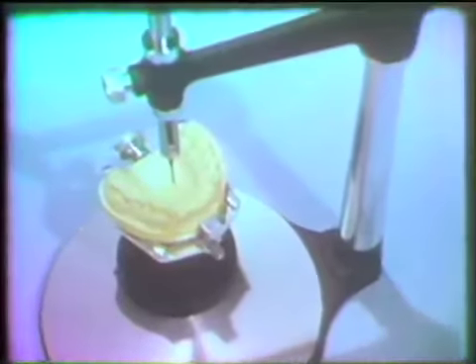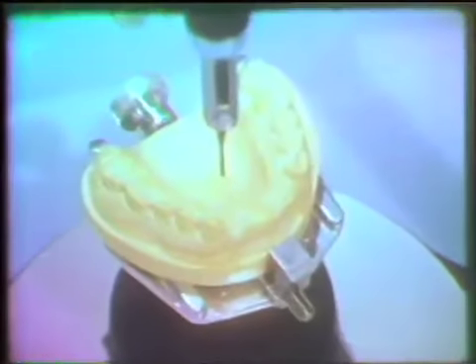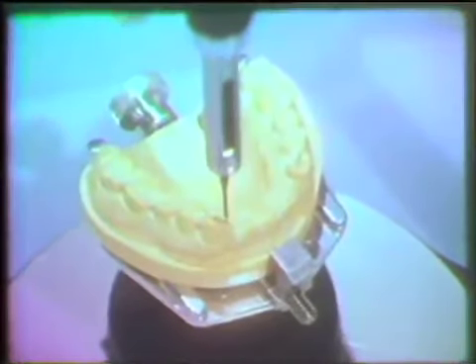When surveying a Class 4 cast for a rotational path of insertion, the cast is mounted with the occlusal plane parallel to the base of the surveyor. The goal is to locate undercuts on the mesial surfaces of the anterior abutments for the rigid retentive elements and buccal undercuts posteriorly for the conventional clasp retainers. As demonstrated, both cuspids have adequate undercuts mesially, and both second molars appear to have sufficient undercuts on their distobuccal surfaces.